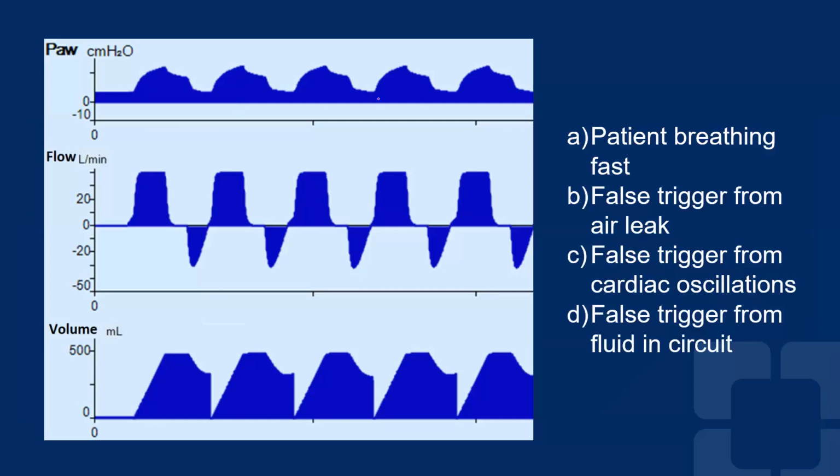All right. From another ventilator, what you have here is pressure, flow, and volume. And what you see here is this pattern, and the pattern is multiple trigger or double trigger. Okay, and so the question is, what is causing this? And this is important for us to recognize that double trigger is not a problem in itself, it's a manifestation of something else. And so we put here several. One of them is auto trigger. So auto trigger can cause multiple triggers.